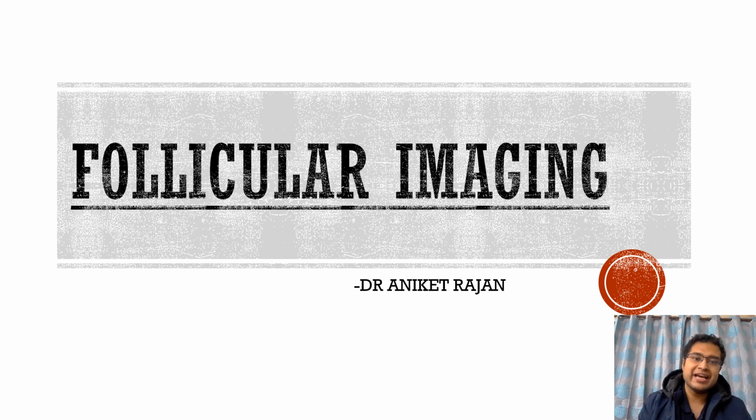So beyond the size of the follicle and the ovarian volume, there are so many other things that we have to look for in case of follicular imaging. So we'll be discussing each one of the things one by one.